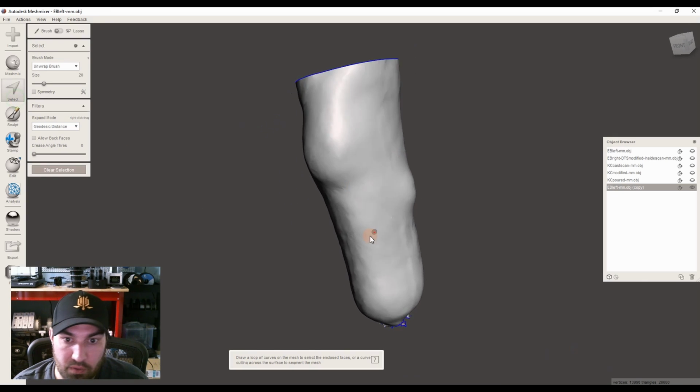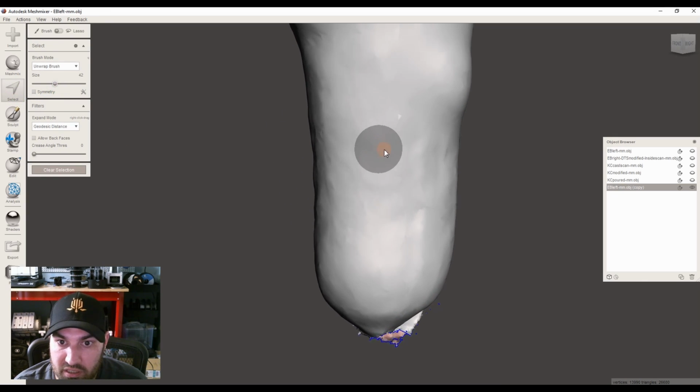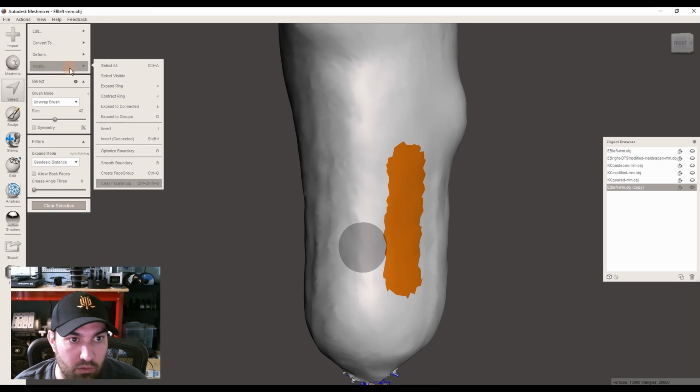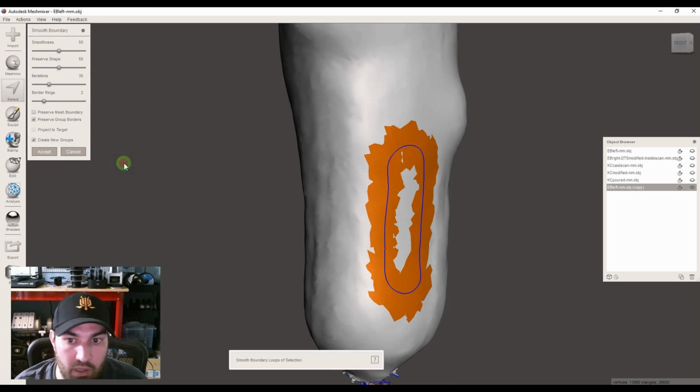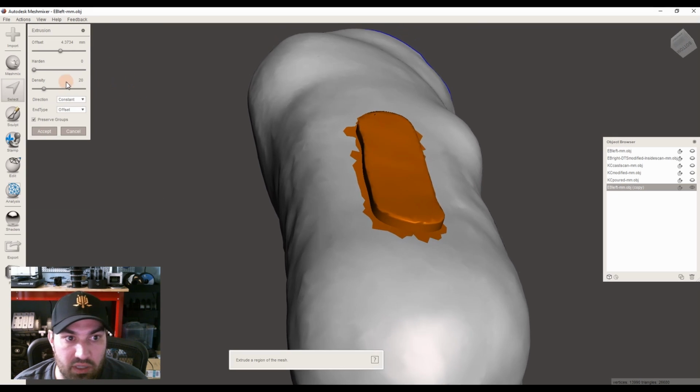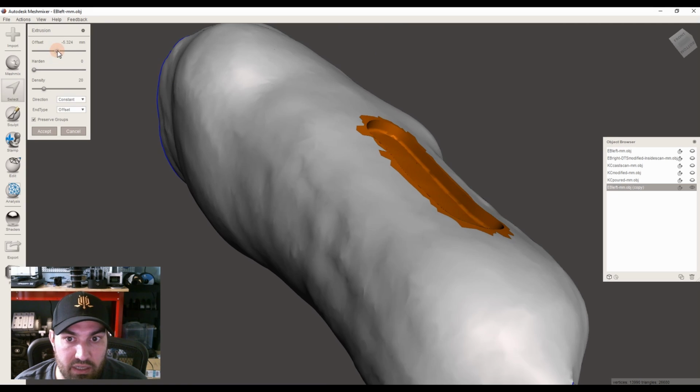You can do the same thing with a reduction. Let's do it real quick. Say you wanted to just carve a little pre-tib channel here. Let's extrude that down so you can slide it, or let's go like -3.